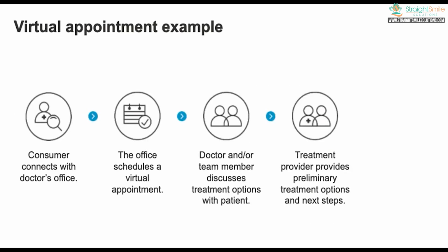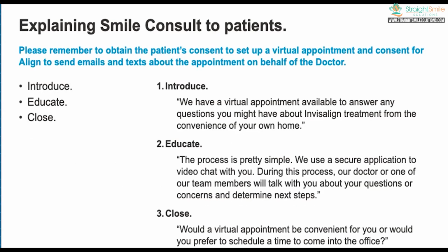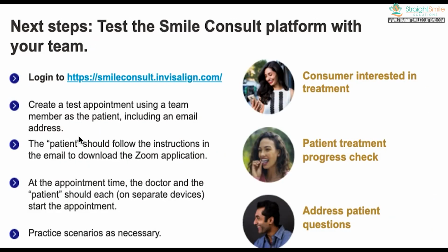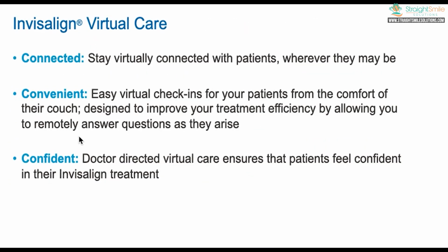So there's some troubleshooting stuff. It's pretty easy. This is kind of their scripting behind it. Let's see. And then beyond that, we've got the virtual care. Now, the virtual care I'm definitely more interested in. It's basically just virtual check-ins. Again, nothing different than we're already doing with dental monitoring, with GP ortho tracking, and a lot of other people who are just using other forms of HIPAA-compliant check-ins.